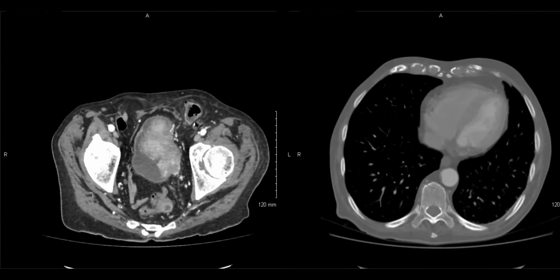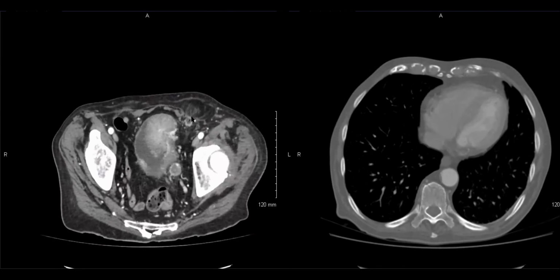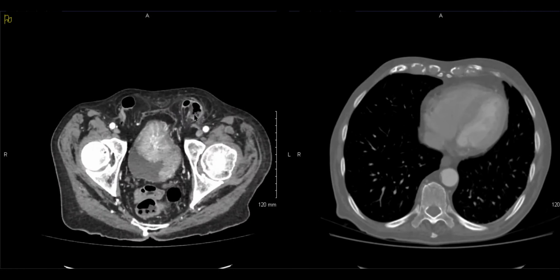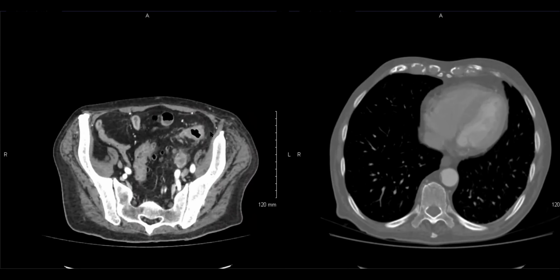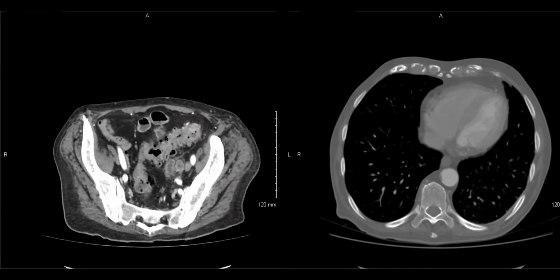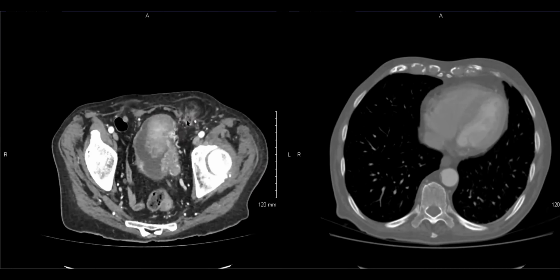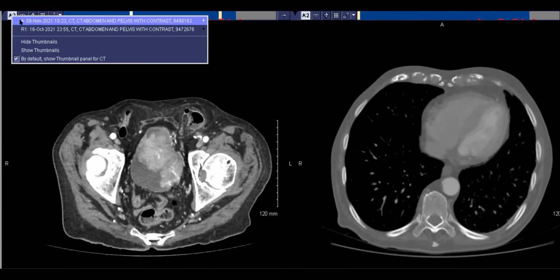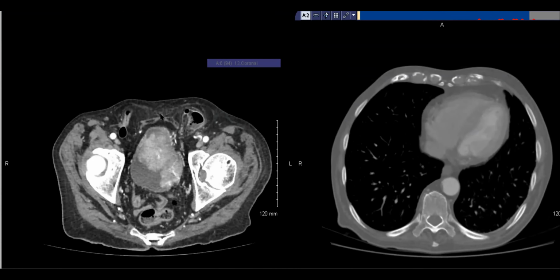All right, so we're reading the case, and then I'm like, okay, well, here we go. We have a hernia with some sort of bowel, and I'm like, wait a second, I don't understand how this bowel connects to itself. So here's the sigmoid, goes up, and then we have this weird loop. Whenever I see this, let's figure out what's happening.